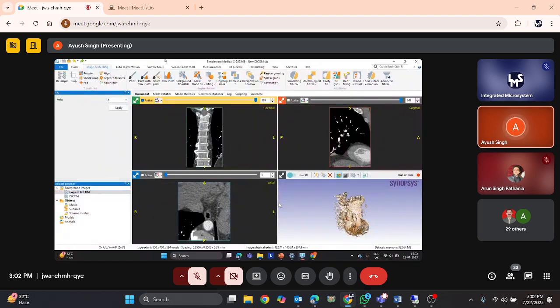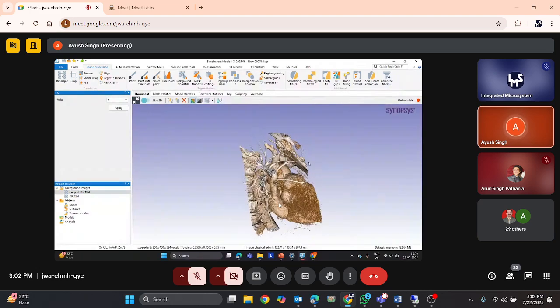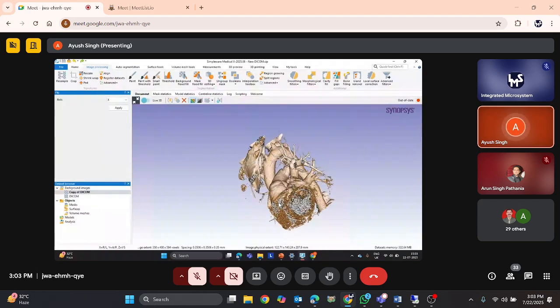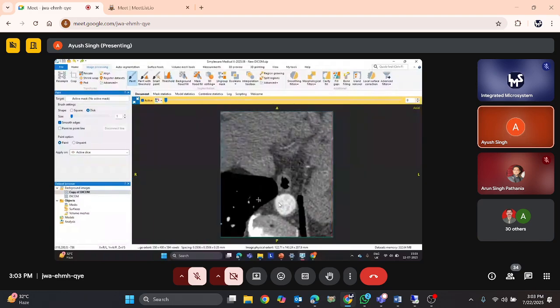Now coming on to the basics of segmentation. Segmentation is quite an important case while we are working on any part. For example, considering this data set, if we're only considering the aorta and we need to mark the aorta and don't require any other region, and if I were going through a conventional approach, I might have selected a paint operation, clicked into a slice, and then marked the region in this slice.